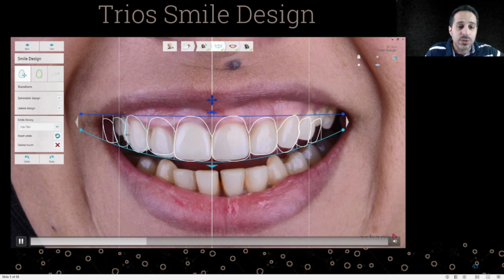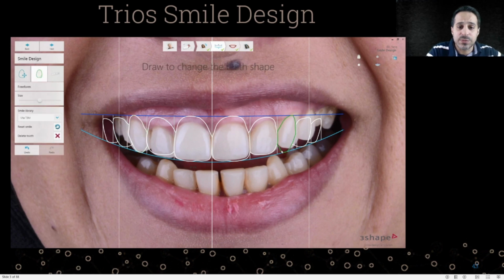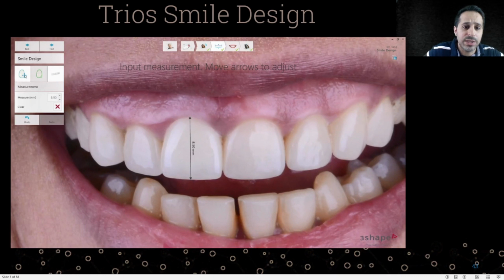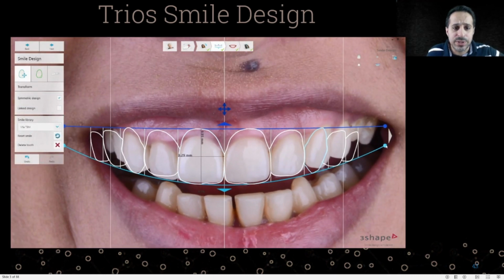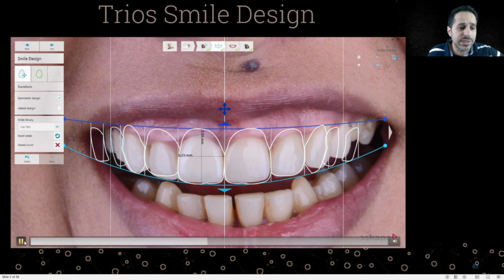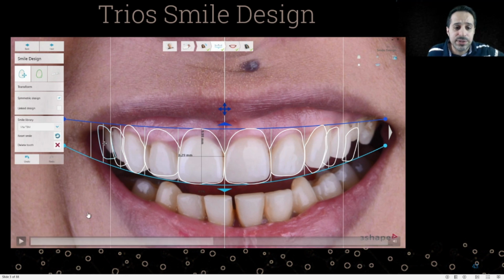This is how the shape will look. So you can utilize the tool which comes with the software and show her exactly how it will look. Here we are showing our patient the actual length of her teeth and how much we can cut from her gum and how much exactly it will be after gingivectomy.